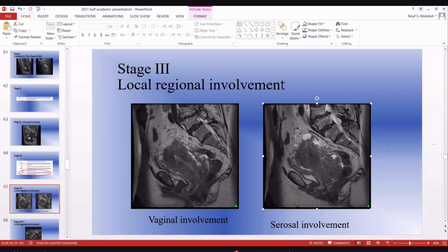So some cases really, sometimes it's really difficult. This turns out to be squamous. Squamous goes better with cervical. The epicenter of the lesion is mainly cervical rather than endometrial. So I would say that this is most likely cervical cancer. However, in this case, I know that it's endometrial because of the staining and because of the histopathology finding. They said this is most likely endometrial rather than cervical.